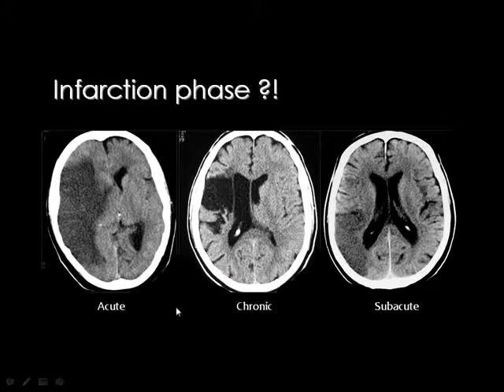The acute infarction is an infarction which is surrounded by brain edema, then it has the chance to compress the ventricle. Then we call this acute infarction. But after some time, this infarction will liquefy, and the brain tissue will be liquefied and transferred into an area of fluid density. Then the result will be loss of volume of the infarcted brain tissue. Then the ventricle adjacent to the infarction will dilate to compensate for the loss of volume.